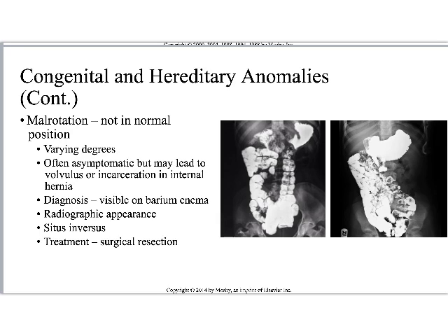Generally, this is visible with barium enema, and it's going to be important that it's a barium enema, right? Because if this patient is having this kind of problem going on, we do not want to be sending barium down this side. You send barium down this side, it hits that. It's like sending it the wrong way up the traffic jam, right? You just hit the traffic jam. You're not going anywhere. Versus if you go the other direction, through the barium enema, okay, we can't get past this traffic jam. Okay, it can just turn around and come right back home, right?